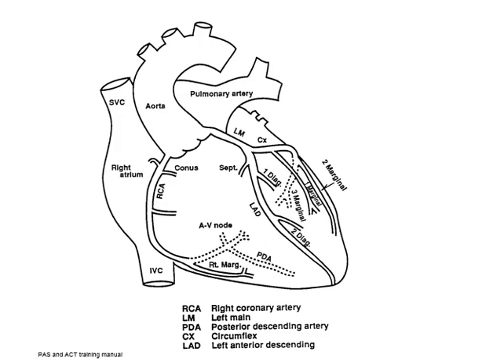This slide is in the RAO position. The heart is in profile, and you have your major vessels there. You can see the right coronary artery feeds the inferior surface of the heart with penetrating vessels going into the heart. Whereas the LAD goes forward right to the apex of the heart and the circumflex wraps around the left lateral surface with marginal branches coming off there, septals to the left and diagonals to the right in the LAD.